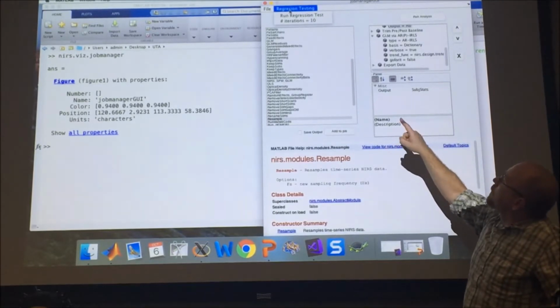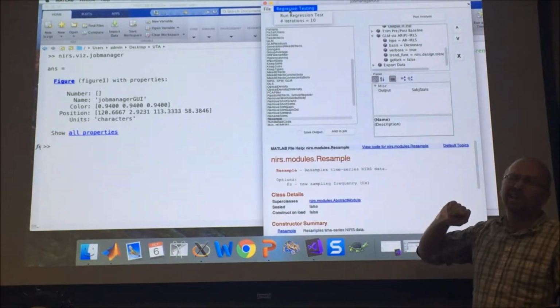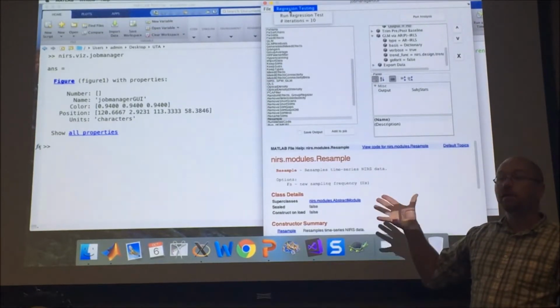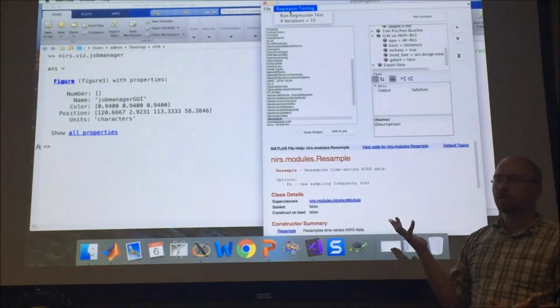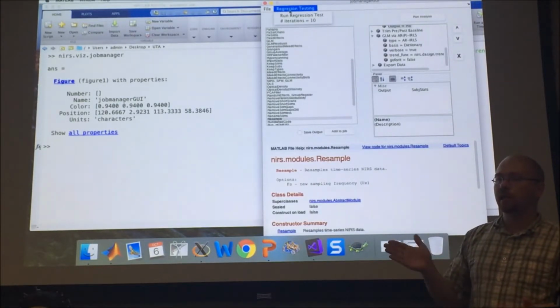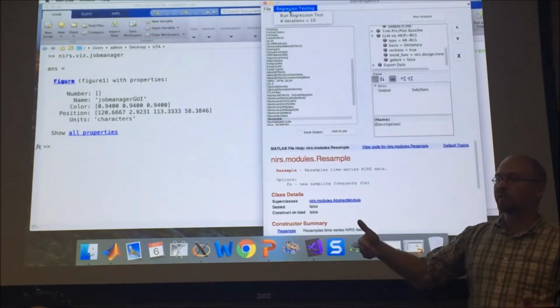here. Right now, if I did that, it would run 10 iterations. It'll maybe take 2 minutes or so to run on my computer here. I'm not going to do it, but it'll actually end up reporting on your pipeline. You can use that, for example, if you invent a new tool and put it into the toolbox, or you want to try out one of the Homer 2 tools that we can also import, and you can start to compare the performance of the different models or the different types of pipelines.